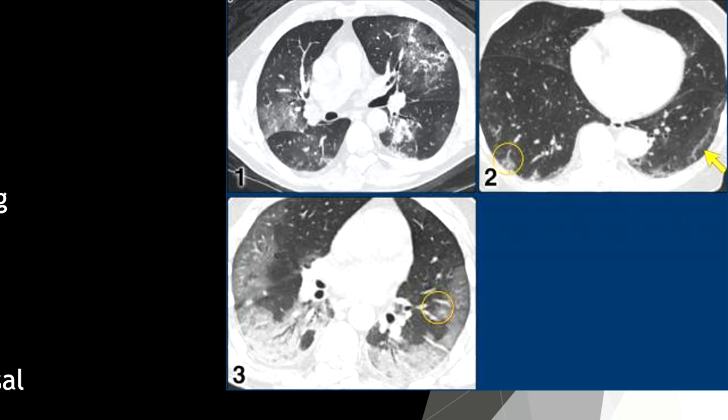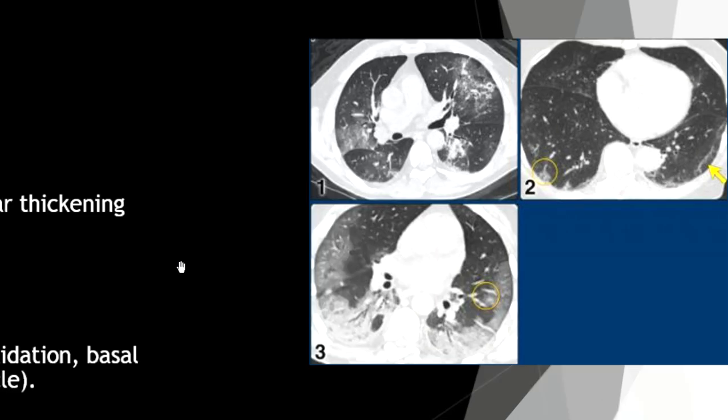And if you see a slightly wider part of the lung and you can't divide where is the parenchyma and where are the vessels, this is consolidation. You cannot assess the vessels of the lung. I hope you understand.